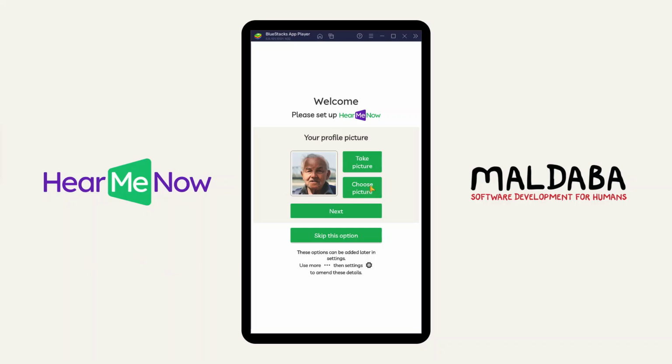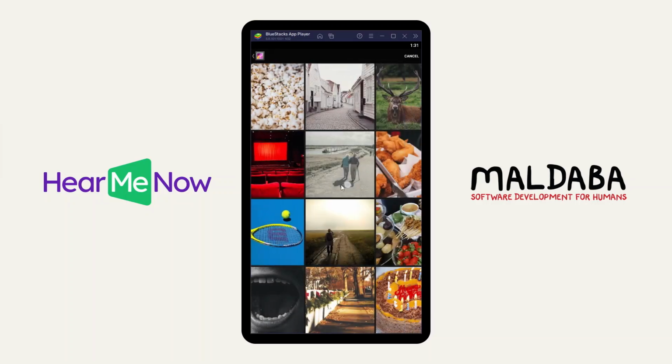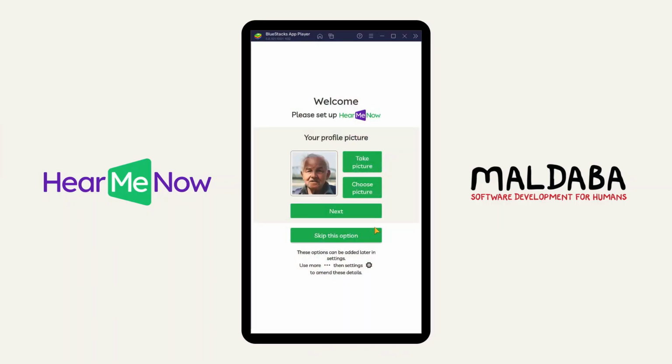Select Choose Picture, browse on your device to the picture you want to use, and select it. You can then go to the next section using the Next button.